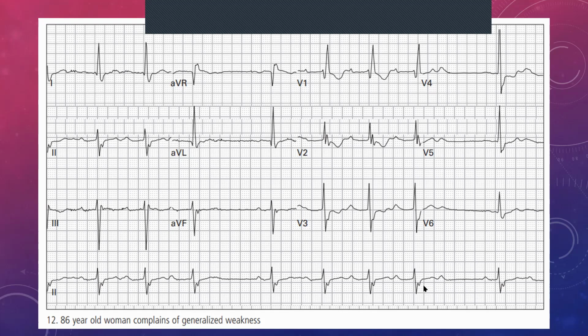I'm not sure if anybody wants to venture a guess as to which heart block this is. You can in the chat. In the meantime, it's not a problem. But we know that we're dealing with a heart block. And we know we're dealing with a heart block where the atrial conduction is slowly but surely elongating, so it's getting worse. And then after that, it drops, and then it seems to reset as well.